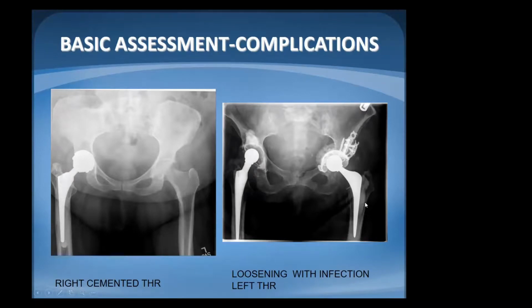That should alert you to the risk of infection. It is very difficult, unless you see gas in the soft tissues and bone destruction, to call it osteomyelitis on a plain film. You probably need more support from cross-sectional images and eventually isotope bone scanning to call it infection and go further to alert the orthopod that you are really worried.